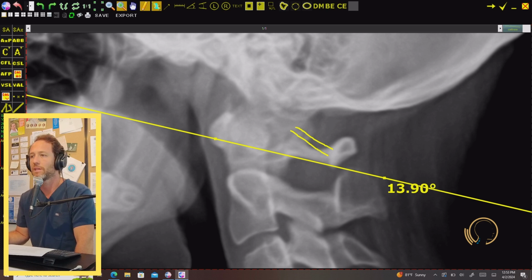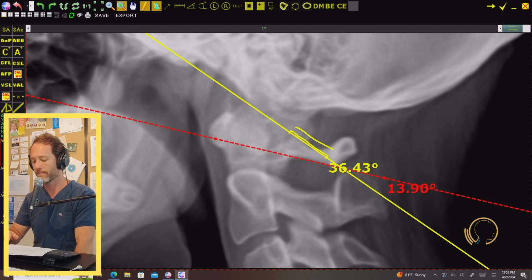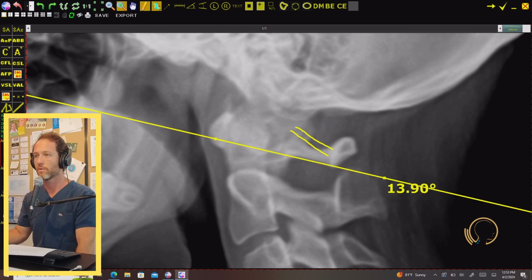But any of that could lead to 2 posterior arches, and the way the technique works is if you got 2 of them, you would do the same kind of thing. You put your dot and then a quarter inch behind it, and then you would scribe a second line, right? And when you have 2 of these, you take the higher one. So you're going to derive your ASP line from your higher posterior arch. So you won't see that very often, but just to cover it, because I want this to be thorough.